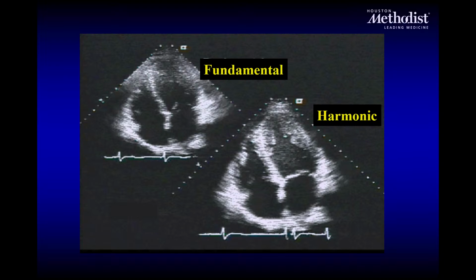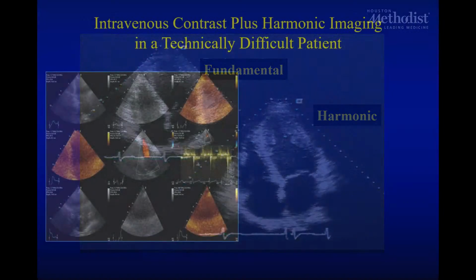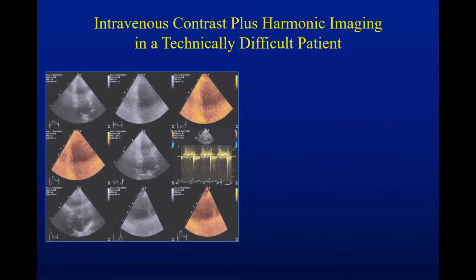I see at times in our sonographers or our trainees that they gravitate towards a lower frequency image, and it will give you a much lower resolution and much grainier image quality. So try as much as you can with the highest frequency transducer. And yes, you could use harmonic most of the time, but at times you may want to use just fundamental imaging for best resolution.